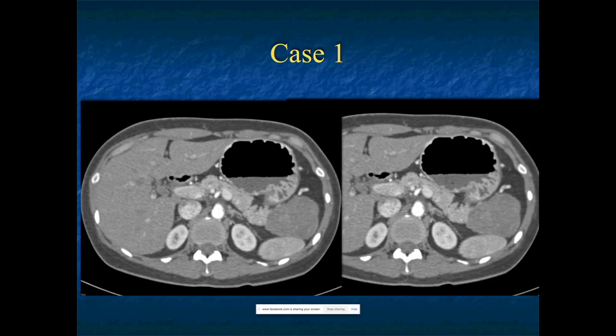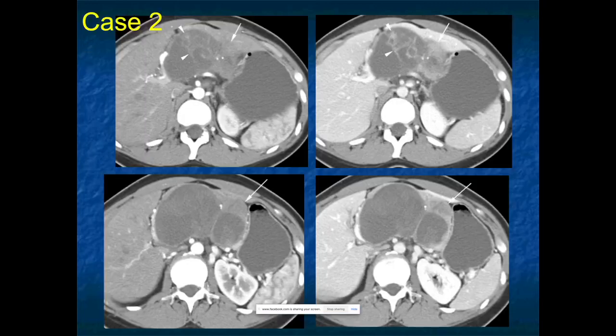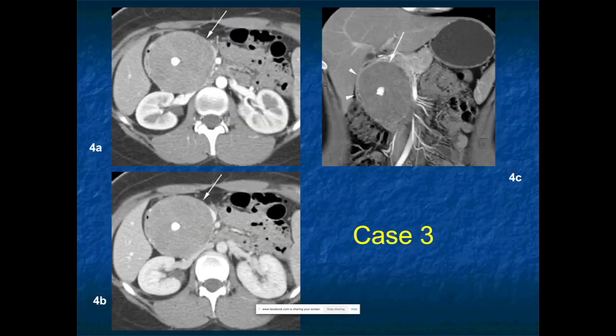Okay, another thing, sort of cystic lesion, tail of pancreas, and large. Some septations. Another example, large cystic and solid lesion with some calcifications within it. Another case, solid and cystic with dense central calcification. Serous cystadenomas can have central calcifications, but they're cystic, they're not going to be so solid looking. MCNs, not good. MCNs have peripheral calcification. IPMNs can be peripheral, not the central, but also it's too solid for an IPMN.